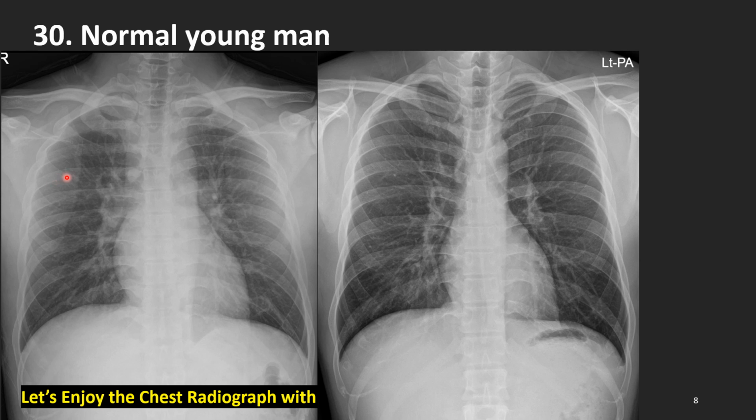Ribs are more horizontal. Mediastinum is wider. The azygos vein is prominent, something like lymph node enlargement, big. And the heart is bigger, with a little fuzzy margin.